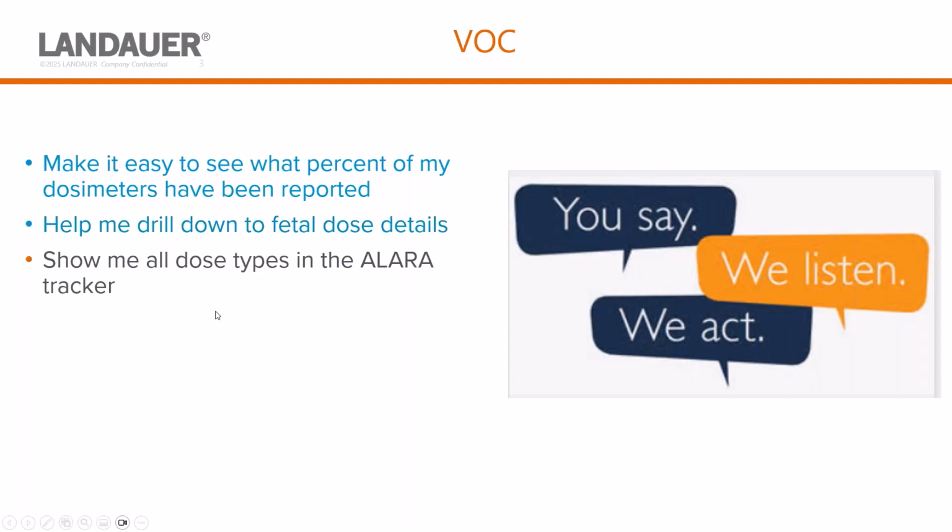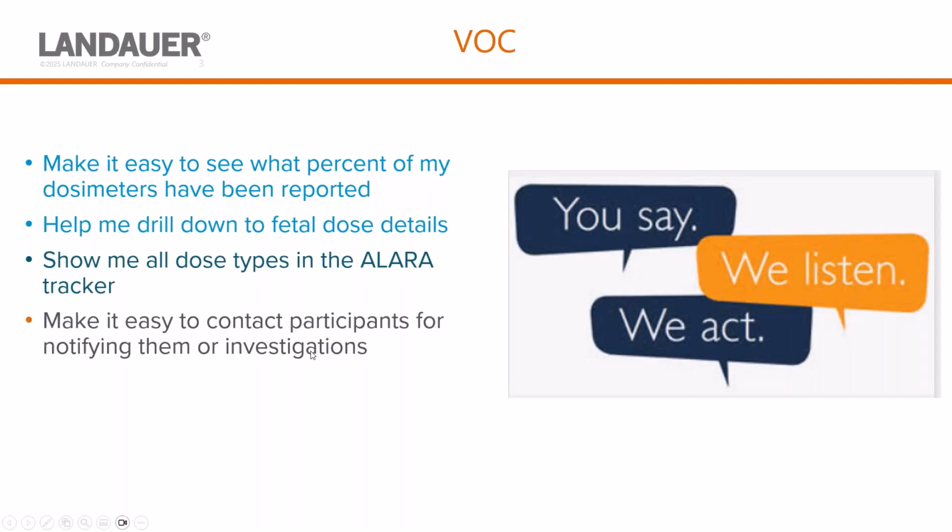And then also around the ALARA areas, having more visibility to all the dose types. So rather than just DDE, you'll see some expanded dose there. Also to make it easy to contact participants. One use case that we kept hearing frequently from customers is that once I look at unused or unreturned dosimeters or even fetal dosimeters, I often want to reach out to those participants who are on that list.